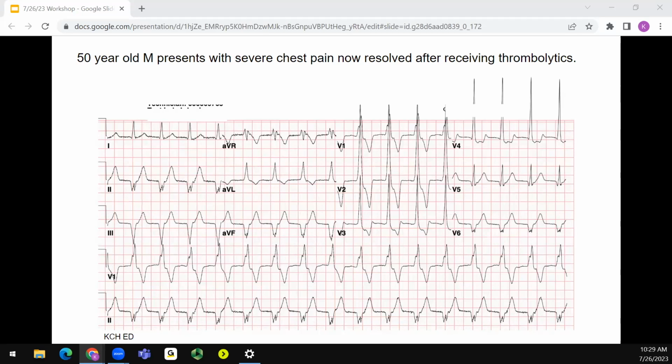What's the rhythm here? Someone whispered junctional. Is it a narrow or wide QRS? It's wide, so less likely junctional unless you have an underlying aberrancy. Bilal says this is AIVR, accelerated idioventricular rhythm. It's basically a ventricular rhythm, but it's not really VTach because it's a little too slow. And this is kind of a reperfusion rhythm after an MI.